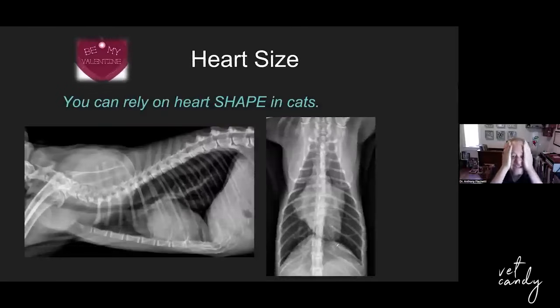Okay, how do I teach heart enlargement to beginners? It's hard to really measure the shape, but I can promise you that this is a very large heart because it looks like a Valentine, right? On the VD view, you've got this bump here and a bump here, and then it tapers to a more narrow apex. That's the Valentine-shaped heart. It works. It's a sign of cardiomegaly. It tends to be associated with a very large left atrium, and in severe cases, a large right atrium.